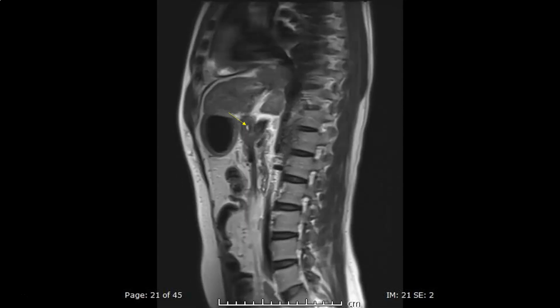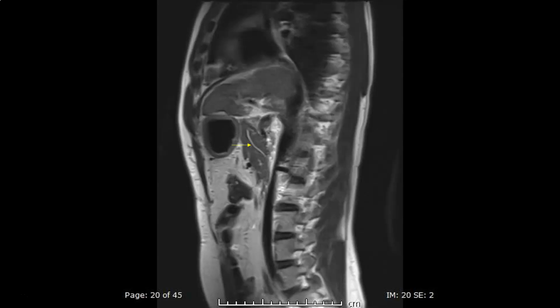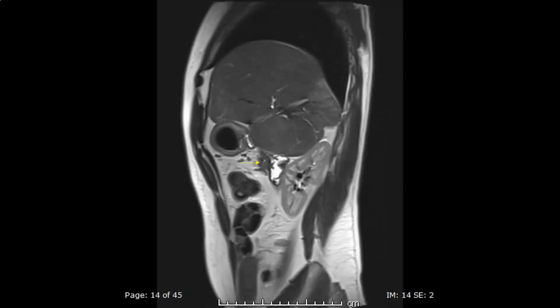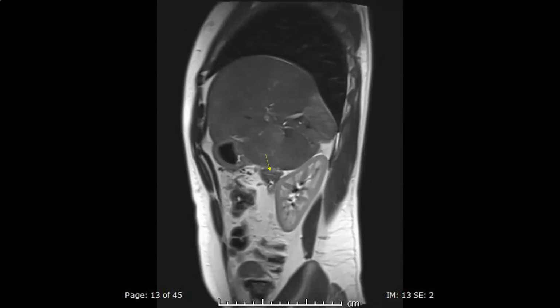We are moving to the right, and here the pancreatic duct turns inferiorly and posteriorly to join the common bile duct. But after joining the common bile duct and crossing in front of it, you see the rest of the pancreatic accessory duct that moves to the right to join the annular pancreatic tissue. And here, as it turns to enter into an accessory papilla on the right side of the second part of the duodenum.